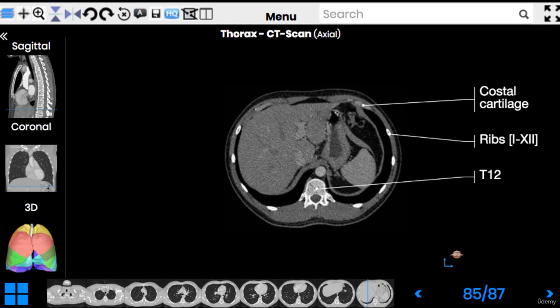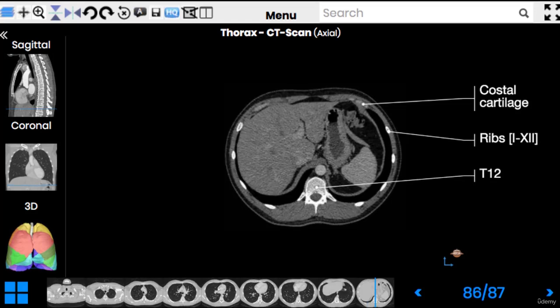The radiolucent area just behind and lateral to the diaphragm, this split here, it is the costodiaphragmatic recess, the kind of empty space between two pleurae. So in our deep inspiration, the lowest parts of the lungs enter this recess and may be found here.